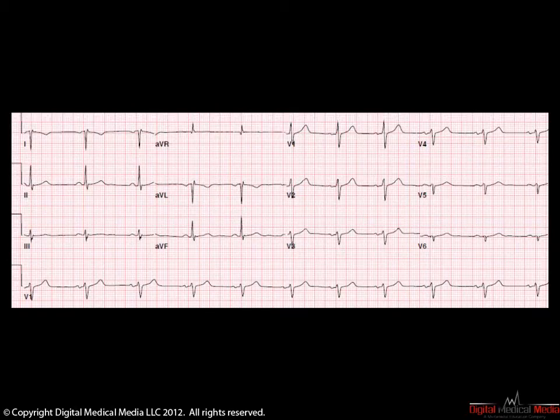However, the P wave is not clearly inverted in AVR, but is inverted in AVL. Additionally, lead 1 has an inverted P and a downgoing QRS. This is very similar to the left arm, right arm reversal that we saw in the previous ECG. Whenever we see this pattern, the most common explanation is indeed that the left arm and right arm leads were reversed. We then look at the precordial leads, because the precordial leads would be unaffected by that error in hookup.